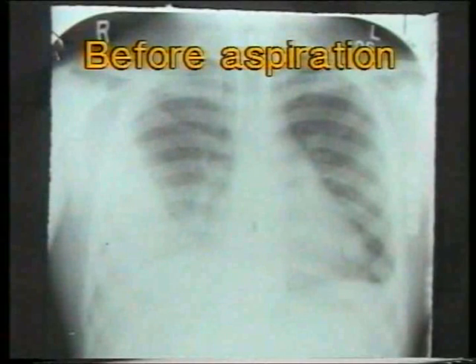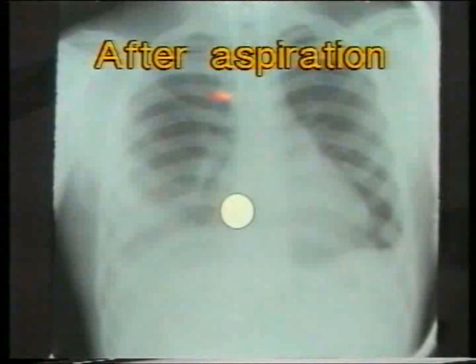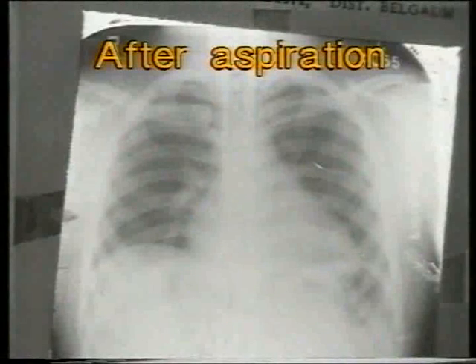This is another set of X-rays before and after pleural fluid aspiration. Note the right pleural effusion. The second X-ray after fluid aspiration shows the pleural reaction as haziness in the right costophrenic angle. And the third X-ray after 2 months of chemotherapy shows a completely clear lung field.